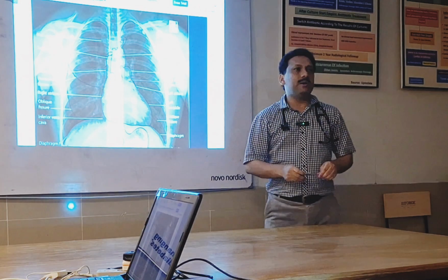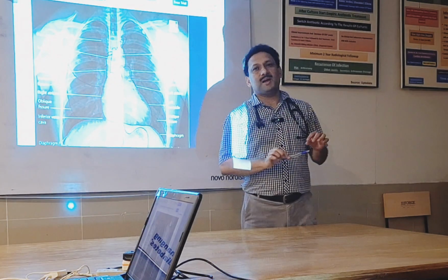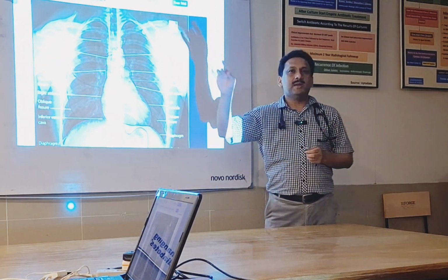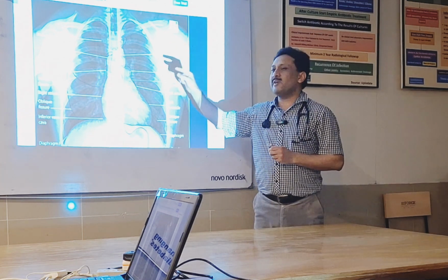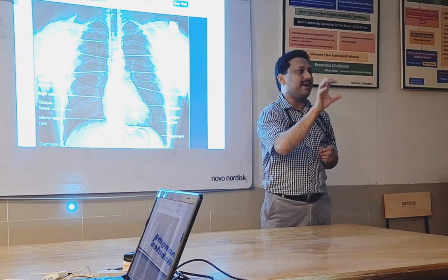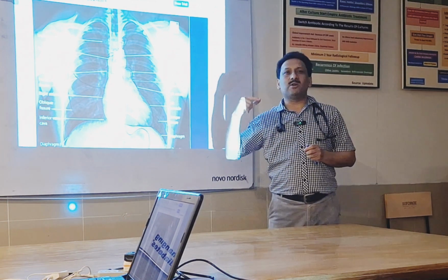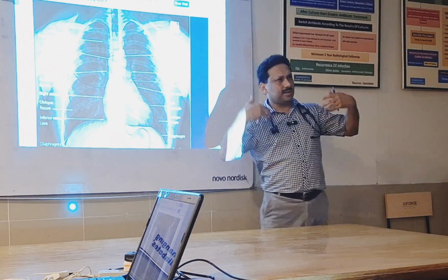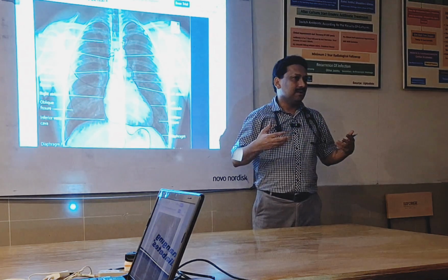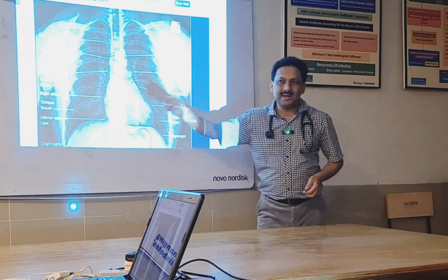Again, before focusing on the next thing, I would like to clearly highlight this fact, and you should be very clear in your mind, that whenever you are going to give any finding on chest X-ray, you will always be describing these findings on the basis of the zones, not on the basis of anatomical landmarks. Like you won't be saying that there is an opacity in the right lower chest, or an opacity in the right infraclavicular region. This is for clinical examination. When you are describing the X-rays, you would be commenting differently.